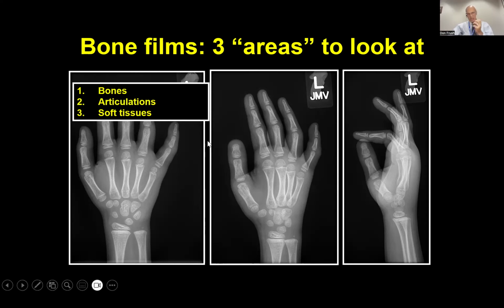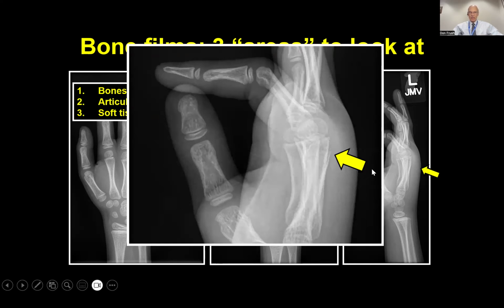As you're looking at this examination here, what should strike you is, if you think about the back of your hand, it's just bones, right? It's bones and skin. There's way too much soft tissue swelling right here. See that? So that's a clue that there's something going on. When you look closely, too, there's a very subtle fracture right there of that probably 5th metacarpal. But this is way too much soft tissue swelling here. So just an example of the things you look for in extremity examinations in terms of the 3. So the checklist: 5 for the chest, 4 for the abdomen, 3 for the extremity examinations.